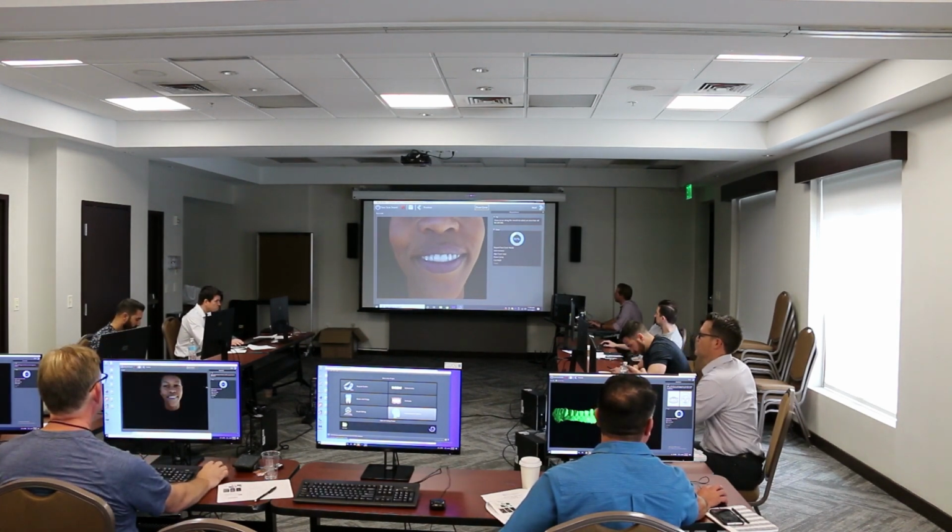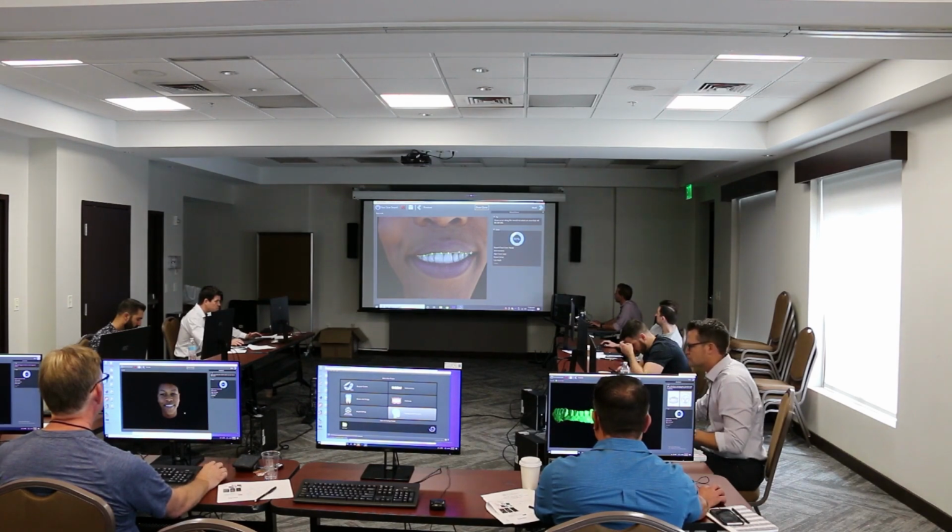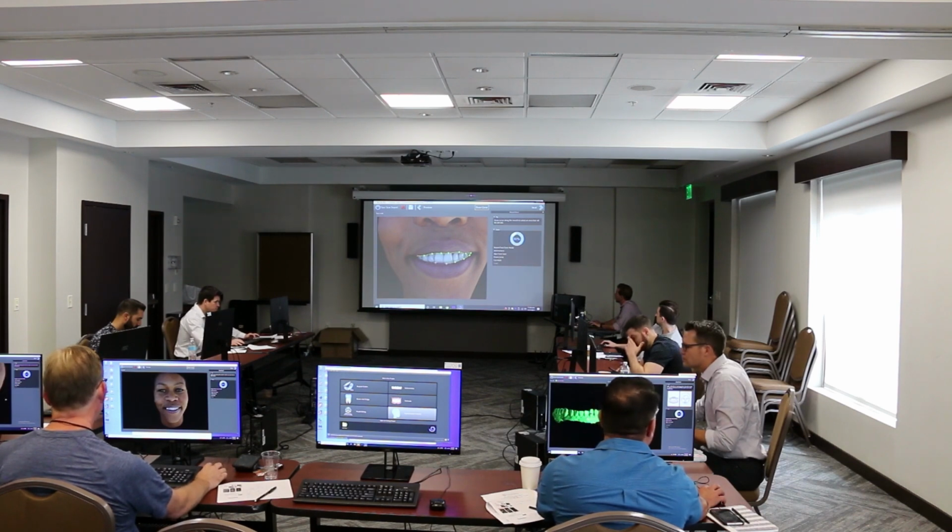So, you're going to look in here, you can zoom in as much as you want, and you're going to just start shift clicking some dots on the lips, because this is where you get to cut out the window of the smile. So you're just going to do a handful of dots here. And then you're going to tell it exactly what you want it to cut out. So this is the lip curve here.